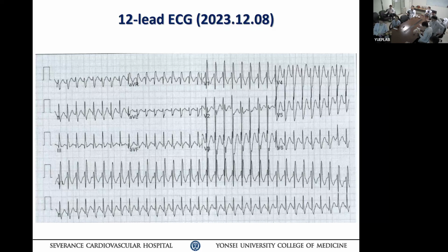그 P웨이브는 리드 3 쪽에서 좀 관찰을 해볼 수 있을 것 같은데, T웨이브에 좀 얹혀있는 듯한 그런 P웨이브 모양이 처음 두 비트에 보이고, 그 다음에는 다시 잘 안 보이다가 일곱 번째, 여덟 번째에서 좀 다시 보이는 것 같아서, 그 어베런시를 보면 SVT 쪽이 좀 더 가능성이 있다고 생각합니다.